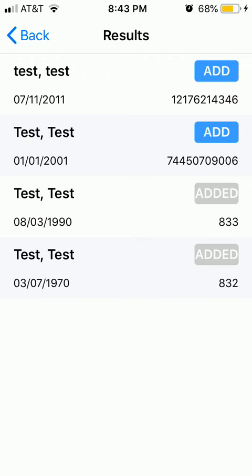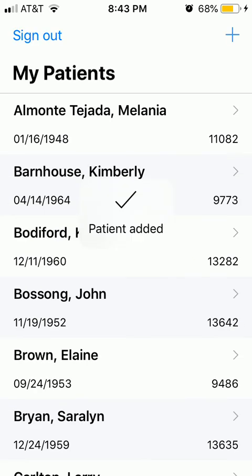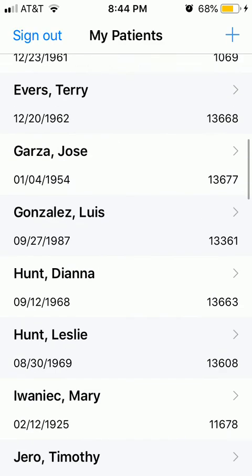Now you can see at the top there are two patients that we can add with different very large unique identifier numbers, and then patients at the bottom which we've already used within the application that have been added. So we'll just use one of the ones at the top. As you can see, those numbers would be very difficult to add, and that's why it's great to have the application do this work for us. So I'm going to add the second one there.